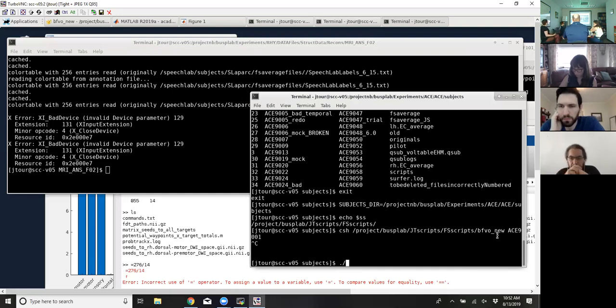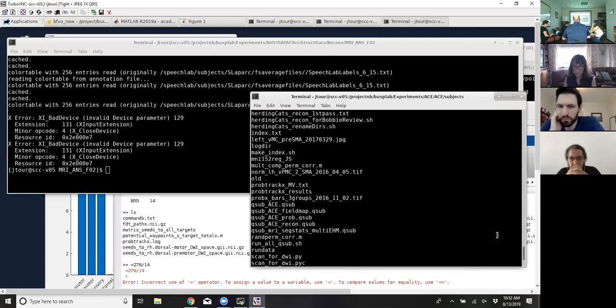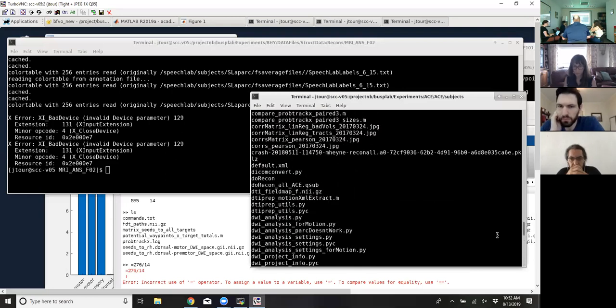But I just want to see if I can. I'm going to take a second on this.